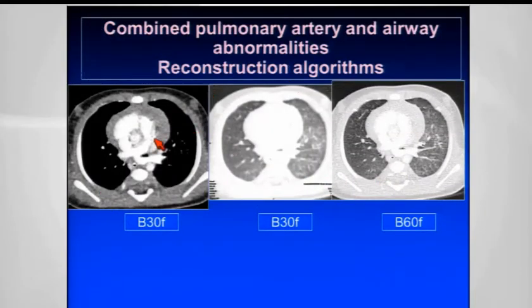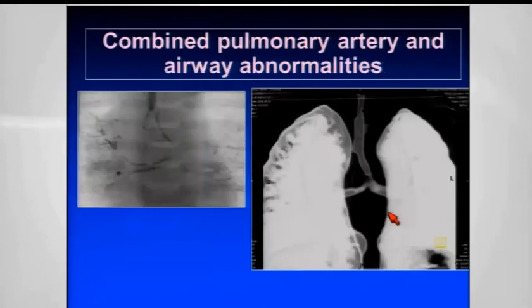In the same patient, you can see the axial soft tissue data, you can see the axial data on lung windows, and you can see here how important it is when you have this valuable data set that you do the proper reconstruction. If you have a soft tissue algorithm on lung windows, the lungs look disgusting. If you then reconstruct properly on a high-resolution bony algorithm, you can see the exquisite detail in the anatomy. And it's really important to remember that you must always manipulate your data set to get optimal lung windows.